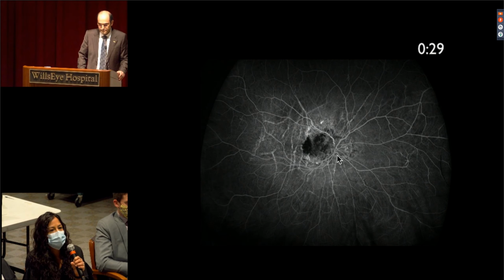And then looking at the macula itself, these darker areas here, I correlate to those areas of atrophy. If we remember the color fundus photo, there were those kind of denser areas of pigment. So, this could be kind of blockage from those dense collections of pigment. And then we see the choroidal vasculature really coming through, likely due to the severe retinal thinning. And then kind of a border of hyperfluorescence. We should watch these areas to see how they behave in the later frames.